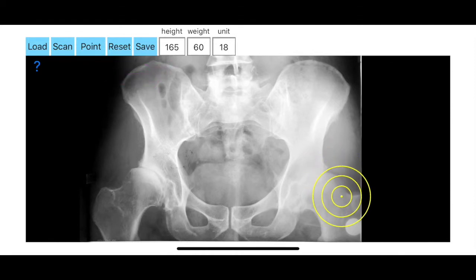After finishing the calibration procedure, you try to locate the center of a template, a known dimension in mm, object in X-ray, for example a coin, by moving the transparent circular yellow template over the object, the coin, trying to fit a best fit circle to the contour of the coin circumference. Once you have found the best fit, by clicking the point button, the center of the coin is marked C1.